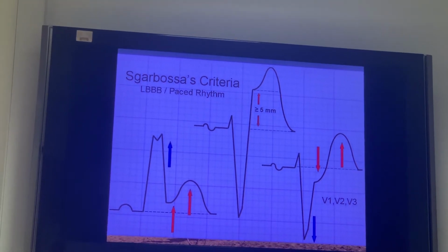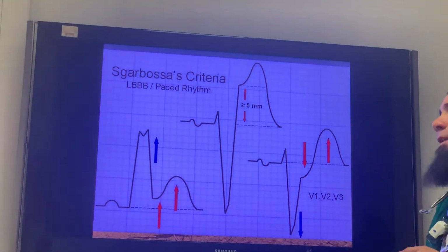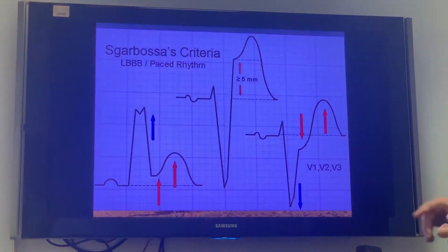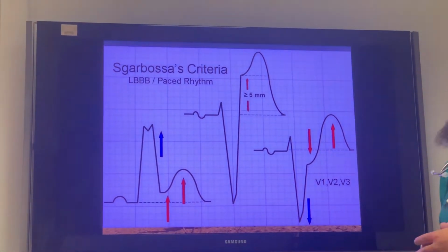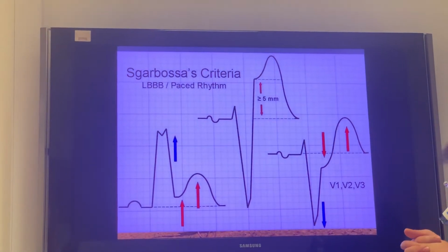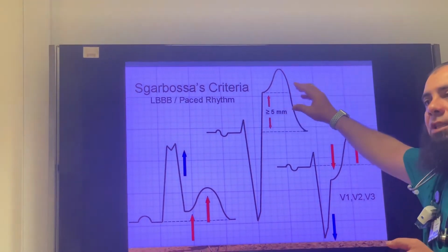Okay. Here one point they needed to discuss is the subjective assessment. What I need to tell them, if I have a low amplitude ECG because of emphysema, because whatever, I have discussed the low amplitude before, I expect the complex to be small and the elevation will be low and everything is low.